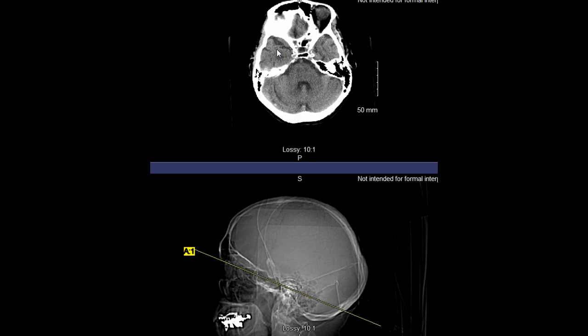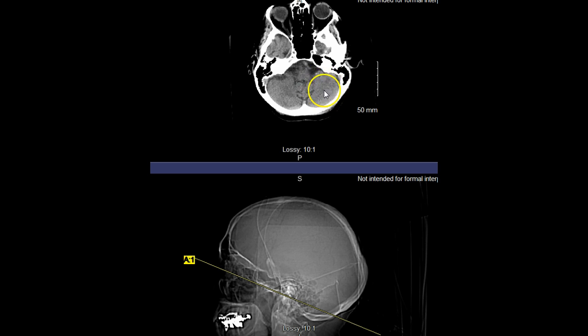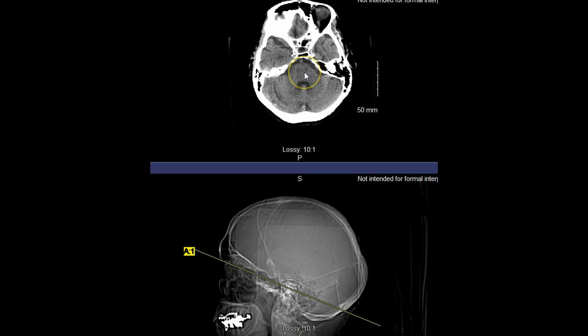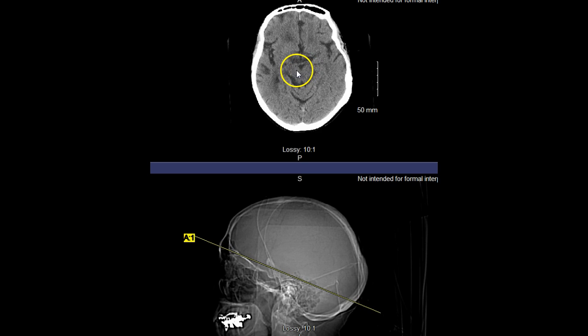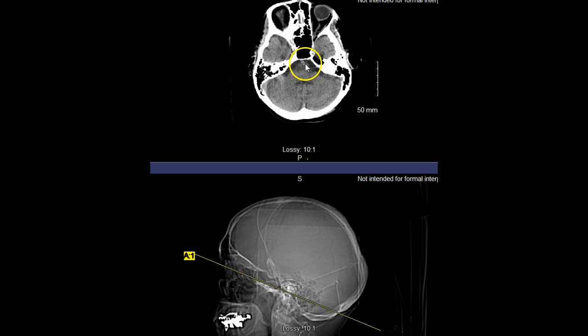Of course, the cerebellum is another structure that you definitely need to know over here in the inferior aspect. You can see the area as we pan down. We can start to see the area of the midbrain here, and then the midbrain is going to transition into the pons. The pons is subsequently going to transition.